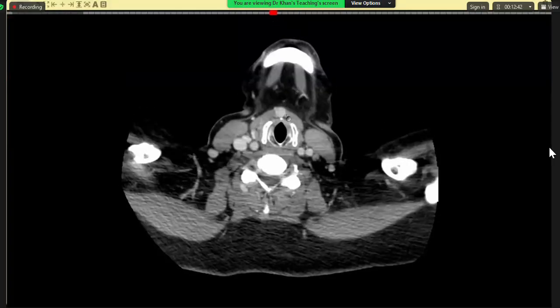So yes, this is a hyperdense, rounded, well-defined nodule seen anterior to the trachea. I'm thinking this might be ranula. Ranula? Hmm? What is a ranula? This is the nodule seen within the neck. Okay, madam. Thank you. Thank you.